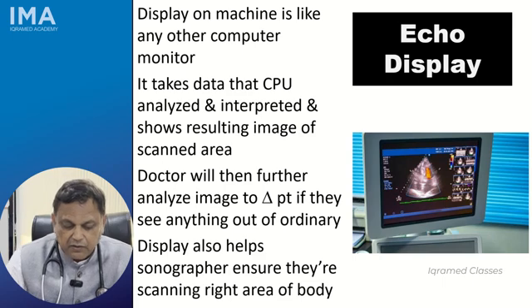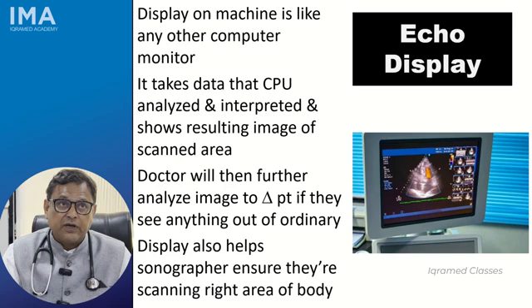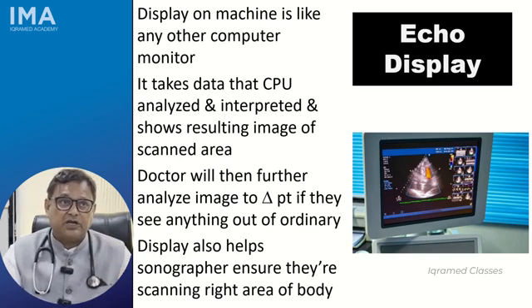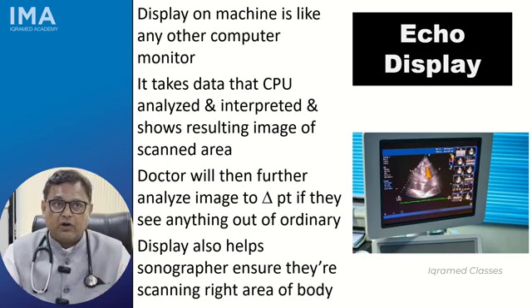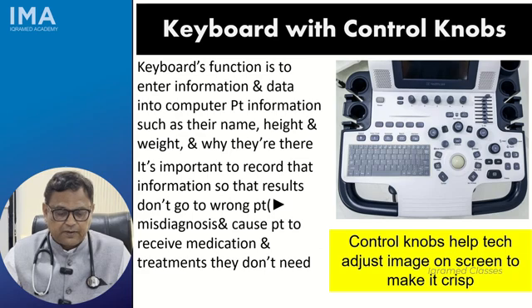It is like any other computer. It takes data that CPU has already analyzed and formed an image. It shows that image here, and you could analyze this image, and you could even change the part and see a different image. So this is the display of the thing.